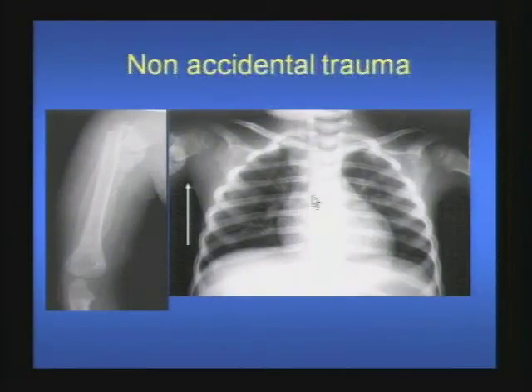Sometimes non-accidental trauma is detected in an unsuspecting child. A child presents for investigation for a different reason, gets a chest radiograph, and there's an incidental note of exuberant callus in the proximal right humerus, and dedicated evaluation of the humerus shows a displaced fracture in the stage of healing with callus and periosteal new bone formation. This was a case of non-accidental trauma. So not only the radiological findings, but the clinical context and the discordant nature of the history are essential to make the diagnosis of non-accidental trauma.